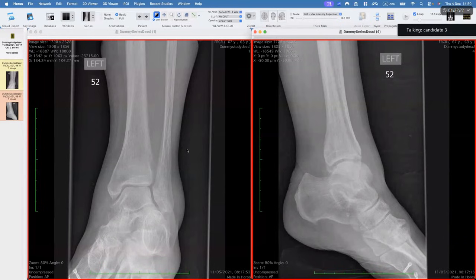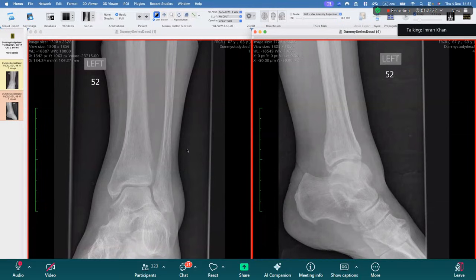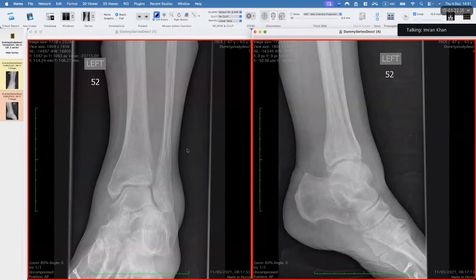I can also see screws down near... Ignore it. Ignore the osteoarthritis at the midfoot. Ignore the screws. The soft tissue swelling is actually subcutaneous lymphedema related to mild heart disease. She's got a history of mild congestive cardiac failure and some chronic venous insufficiency. Ignore all those three.